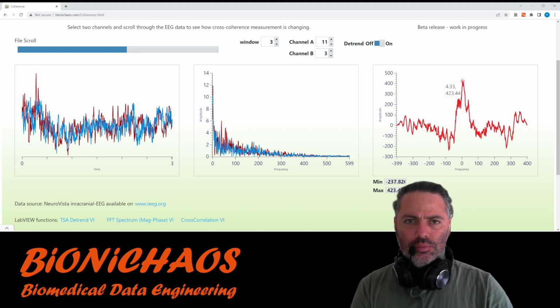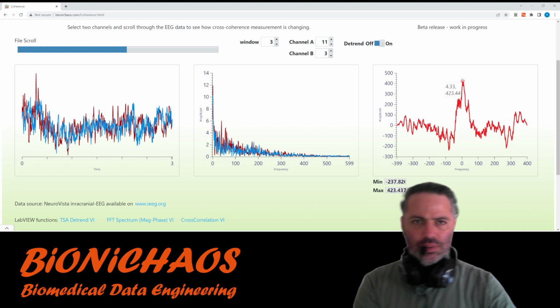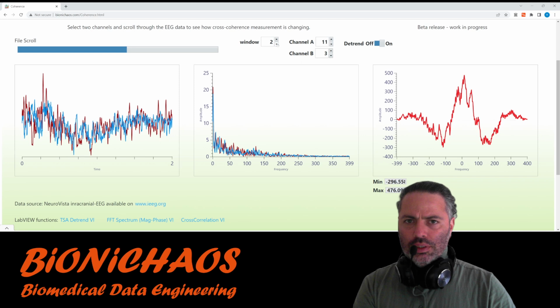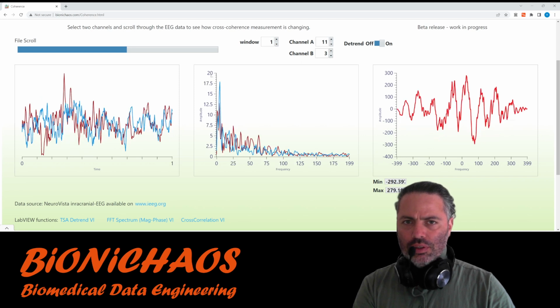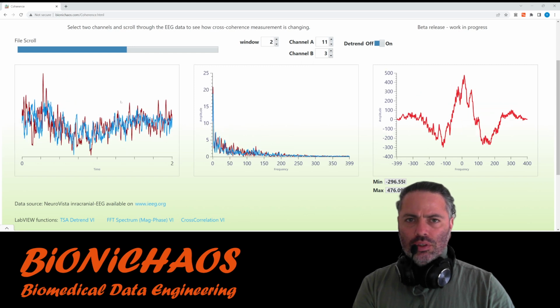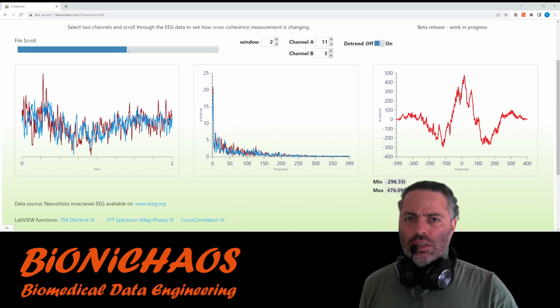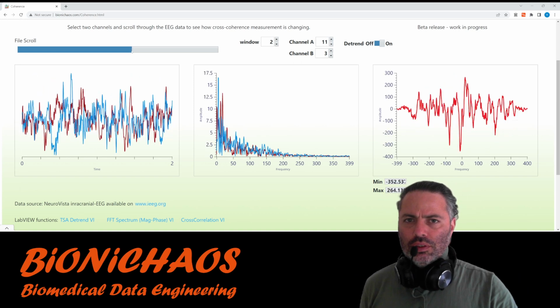Oh, there was a high correlation there as well. Yeah, this one. I don't know what's happening there. There's a peak here. There's obviously some correlation there. You see same peaks in the FFT, but yes, there's a lot to untangle there because some things are actually different. And this is two hemispheres, so potentially this is some sort of artifact there.